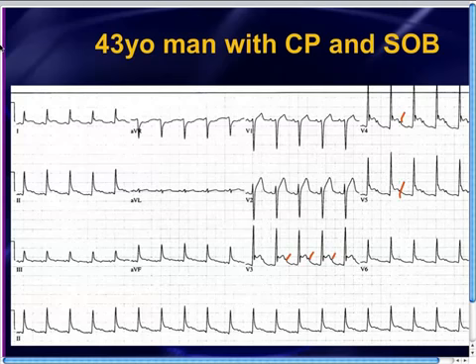And as we mentioned in previous weeks, whenever you see extra blips or extra stuff, that's the other technical term, extra stuff in the rhythm, you've always got to wonder, are those extra P waves? And in this case, we'll take a look at lead V3 just for the heck of it. Lead V3, there's definitely a P wave there, and then there's something there, and I don't know what that is, and then there's a P wave, and there's another question mark there.